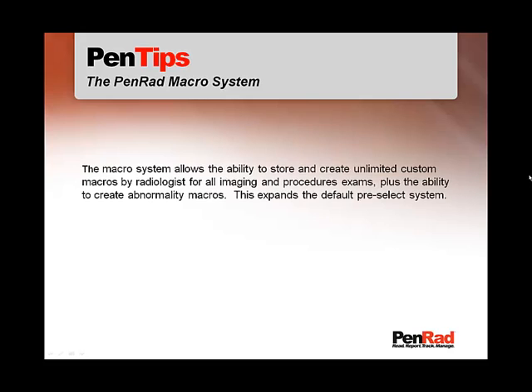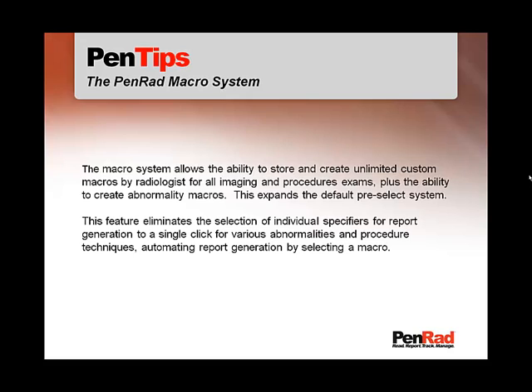The macro system allows the ability to store and create unlimited custom macros by radiologists for all imaging and procedure exams, plus the ability to create abnormality macros. This expands PenRad's default pre-select system. This feature reduces the selection of individual specifiers for report generation to a single click for various abnormalities and procedure techniques, automating report generation by selecting a macro.